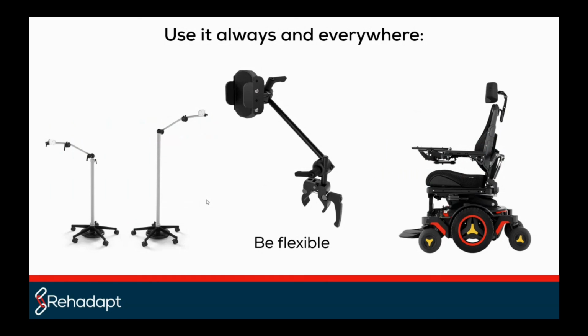If this is not stable enough for you, you can combine it with all different kinds of table mounting solutions that you can stand on a table or also clamp on a table with a table clamp. And also here, you can use the same tablet adapter, connect it with the tablet system, and have it well positioned on the table where it is important for your beneficiary.